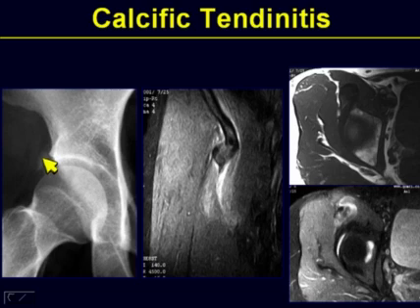For academic sake, although it's so clearly unnecessary, let's look at the corresponding coronal view, and you'll notice that on the fluid-sensitive T2 sequence there is increased fluid collection trickling down, but also a signal void surrounding the same rind that represented the calcification. If you look at this on actual MR images, it is very difficult to immediately detect the abnormality on the anatomic sequence.